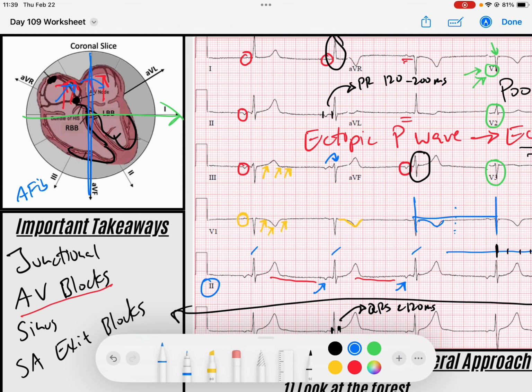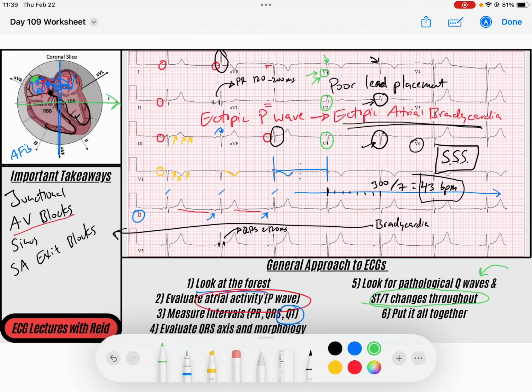We get all these fibrillatory waves all the time in the atria, and it just continually stimulates the AV node. The SA node gets overstimulated by these fibrillatory waves. It's just depolarized over and over and over constantly. So whenever these people go into a non-AFib rhythm, a lot of times that sinus node is just not doing well. It's not a great pacemaker. So that's actually what happened with this patient. They've got sick sinus syndrome from long-standing atrial fibrillation.